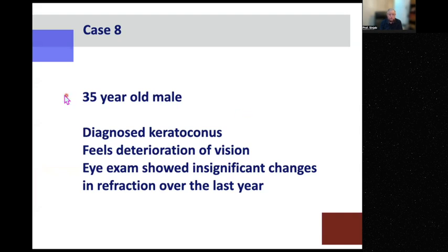Now, this one is a 35-year-old male, already has keratoconus, but feels deterioration of vision. Eye exam showed insignificant changes in refraction over the last year. So same refraction. So let me go back to our question. Can low myopia cause low contrast sensitivity? No.